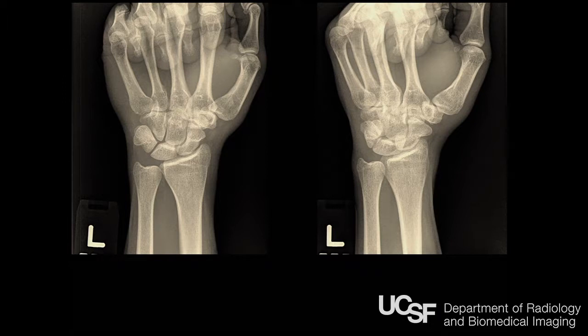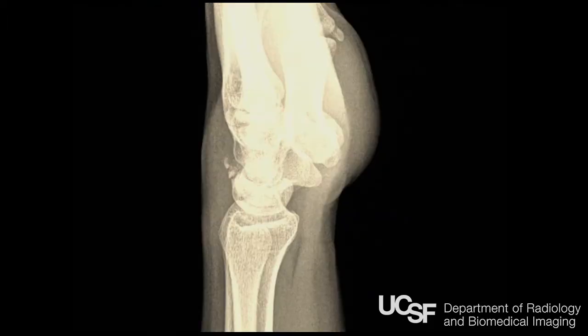When we're looking at radiographs, we often get 3 views, and the reason is that something is often invisible except on just one view. So you want orthogonal views and then usually an oblique. Here's a case where you can't see anything wrong, but you get the lateral view and you can see there are a couple of bone chips off of the triquetrum. A really, really common fracture, and if you don't look at every wrist for this, you're gonna miss it.